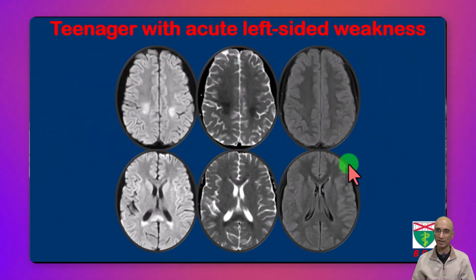So we have a pediatric patient who presented with stroke-like symptoms with true restricted diffusion in bilateral centrum semiovale and also in the splenium of corpus callosum without corresponding FLAIR hyperintensity or enhancement. The radiologist who read the scan quite appropriately called this concerning for metabolic toxic encephalopathy.